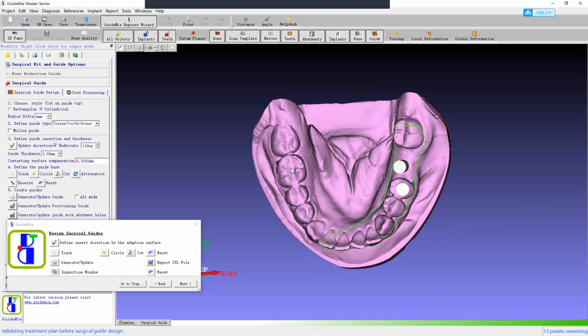So in that case, if you design the guide for the full arch, you could have a situation where the undercut is too much and the guide setting is a problem unless you change the undercut value. In that case, you're probably better off just doing 2 guides. If there's not too much undercut, and if the registration is good, we just do 1.